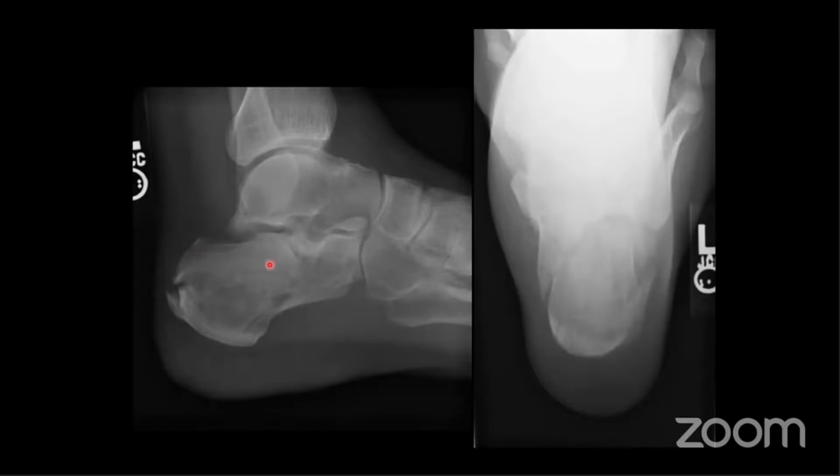So yeah, this is a comminuted calcaneal fracture. I agree, Bohler's angle is flattened. Sometimes they're more subtle than this, but this is very comminuted and fragmented. What's normally the mechanism for calcaneal fractures?